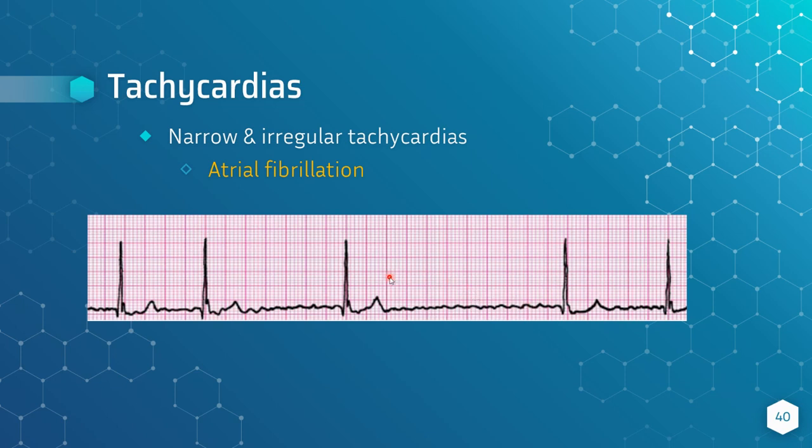And so remember, your AFib is never going to be regular, because you can't have a regular rhythm where the electrical activity originates from an irregular site. So since you have so many impulses and it's so irregular, you can't ever have a regular rhythm unless you have a heart block with AFib. And usually you'll see that when your heart rate's low in the 30s.